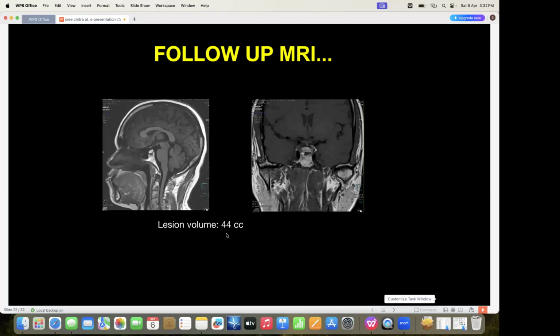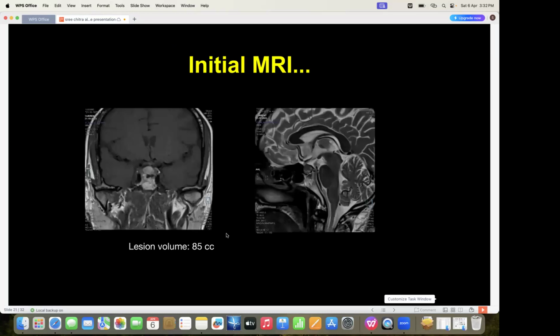So protein-containing lesions, what can you think of in the sellar or suprasellar region? Rathke cleft cyst can be there, but the location is not typical. I couldn't see a normal pituitary separately, so the entire pituitary is increased in size, then followed by decreasing size.